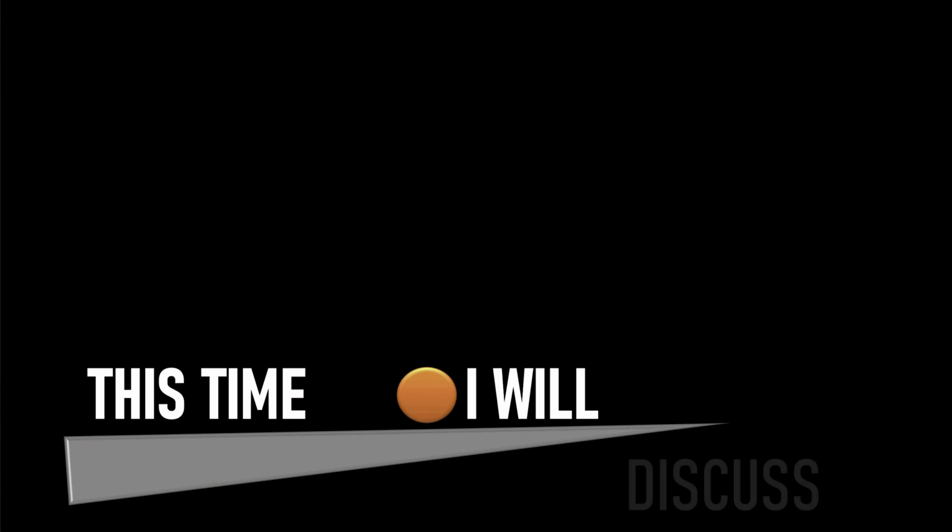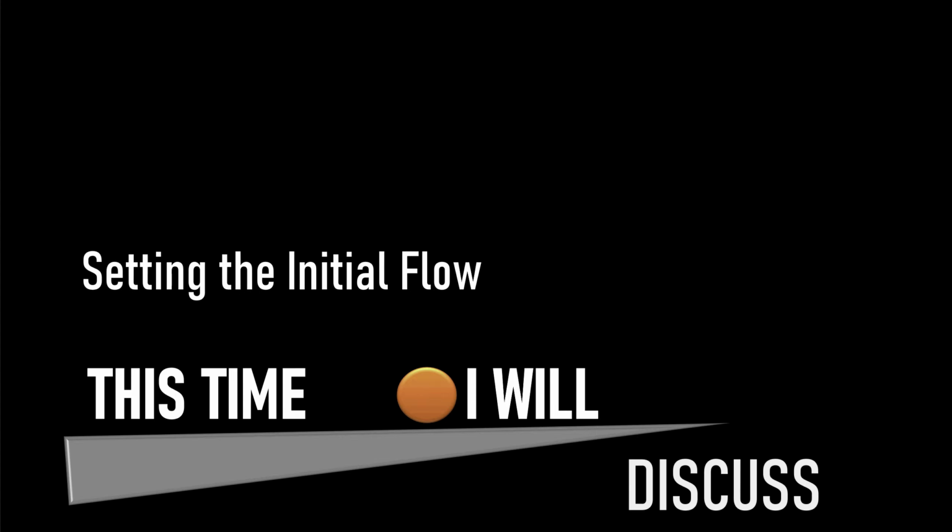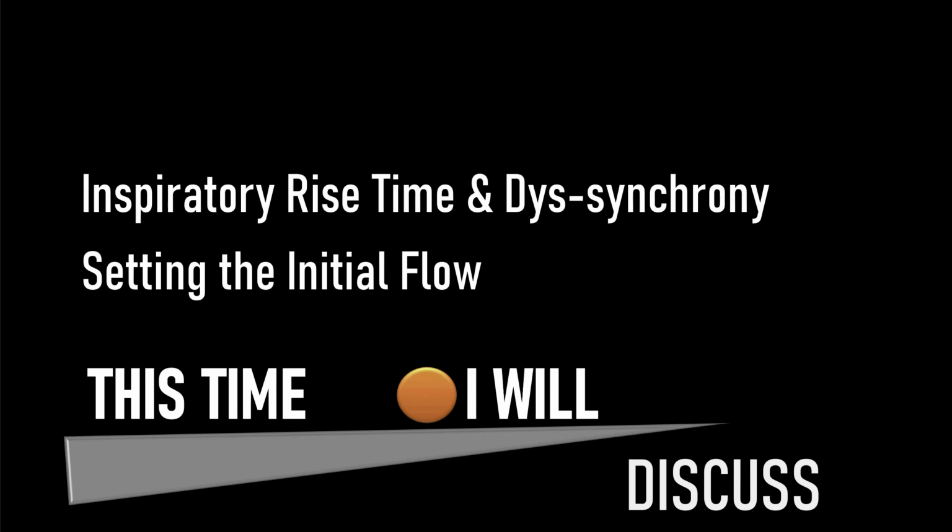In this tutorial, we will look at the initial flow of gas after the ventilator has been triggered in pressure-limited breaths, and then we look at one specific setting, and that's the inspiratory rise time, or the slope of the inspiratory flow curve. And when we've introduced the concept of the rise time, I'm going to look at dyssynchrony at that very, very early stage of the breath.